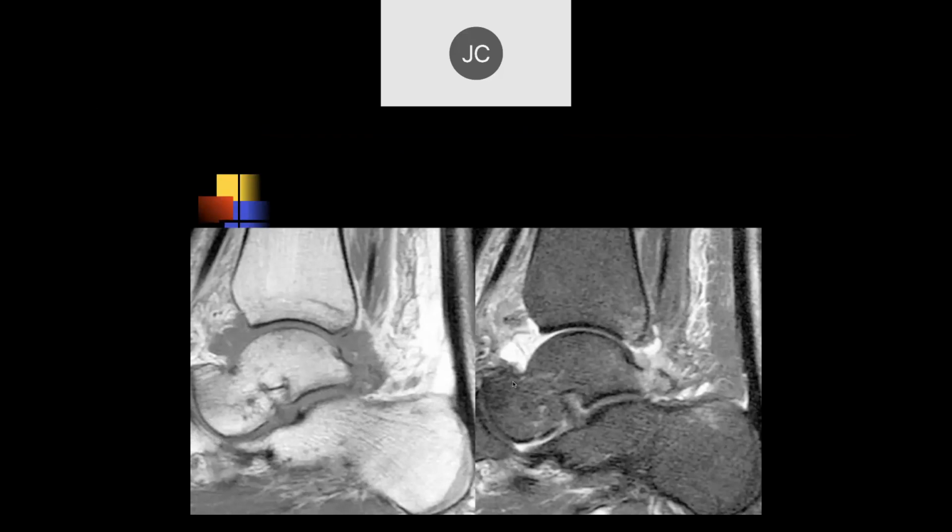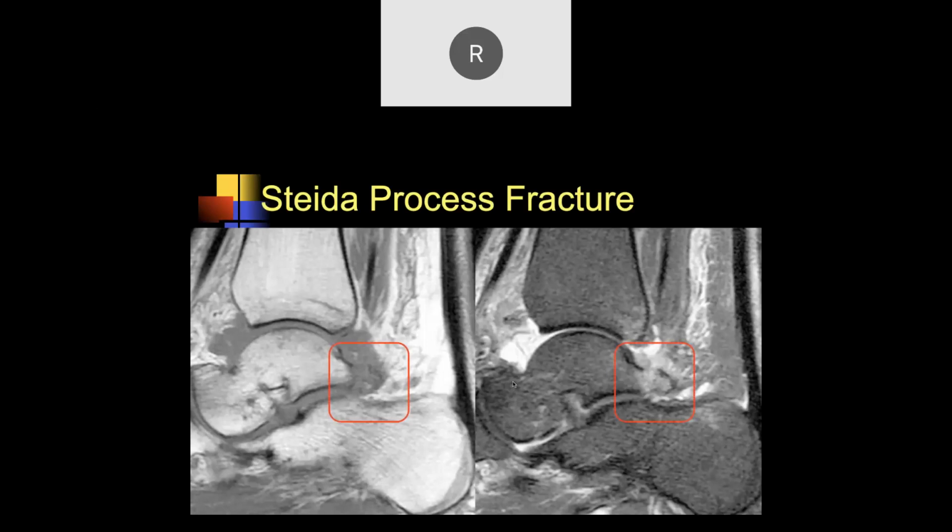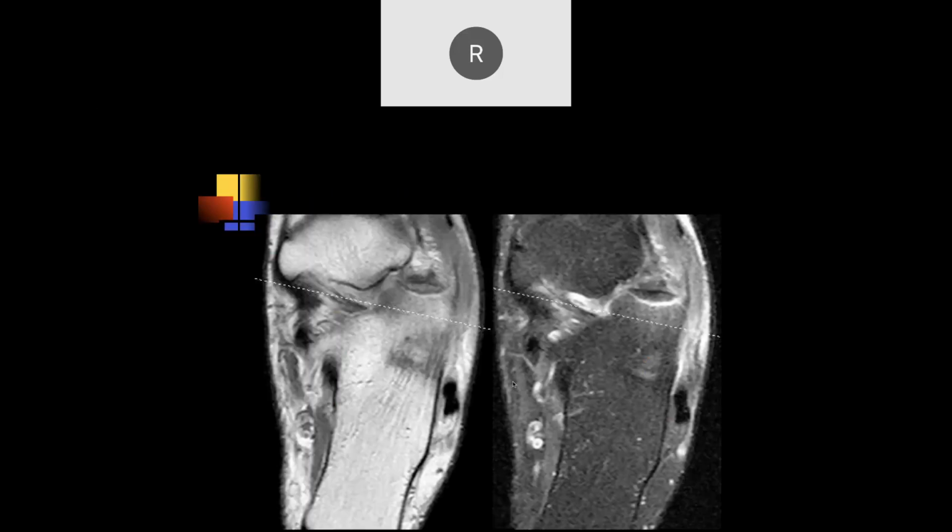Okay, Robert. Okay. Here it looks like there's a prominent steida process with edema and I think a fracture. So that's a fracture of the steida process. Okay. What do you think?